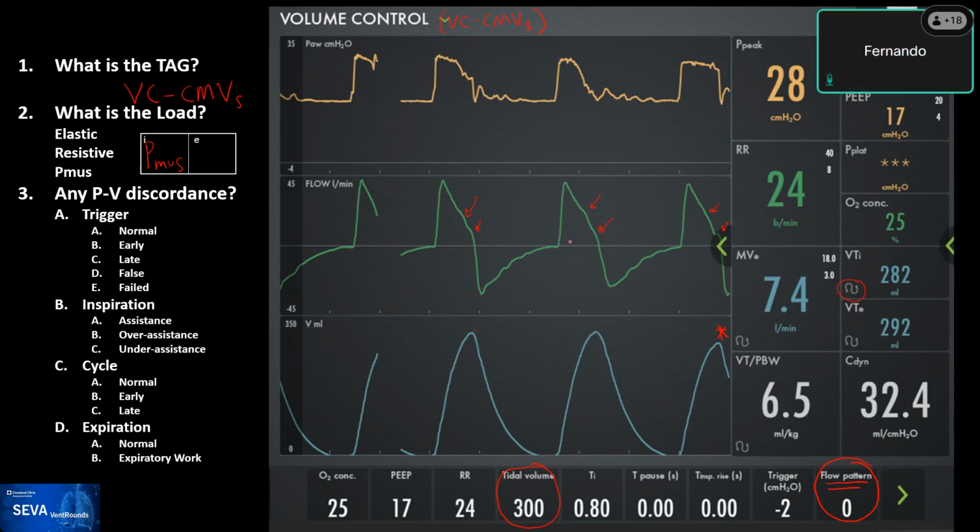The fact that you don't see a perfect geometric decay of the inspiratory waveform, I mean, that you see some deformity of the waveform upwards, that's what can let you think that there's some activity there, there's some PMUS. Yeah. So the way that I like to think about this, this can help you.